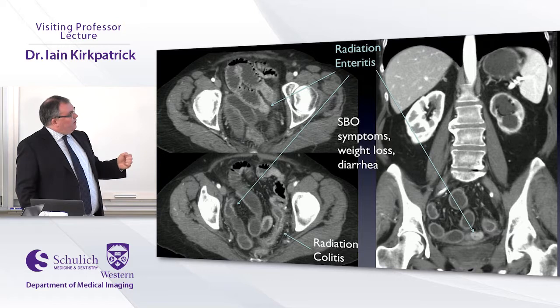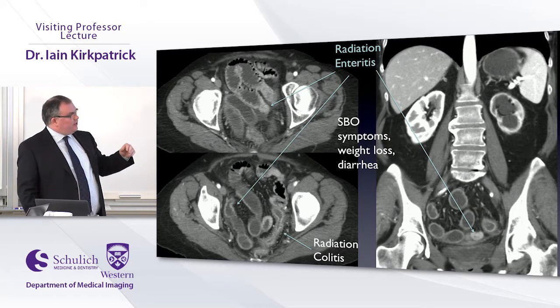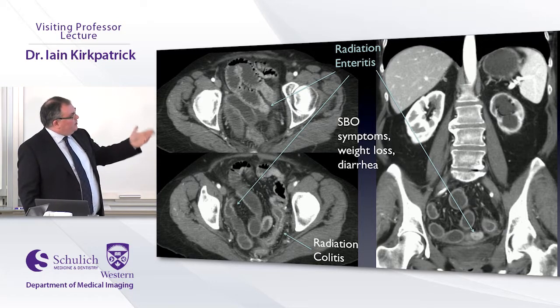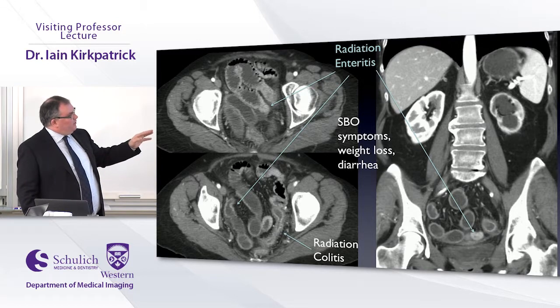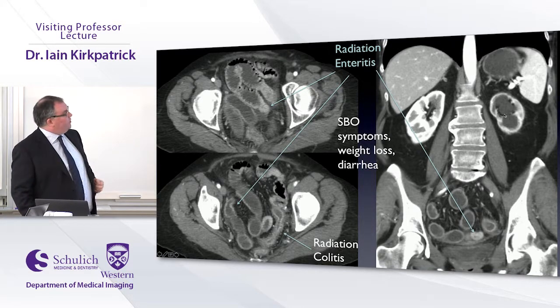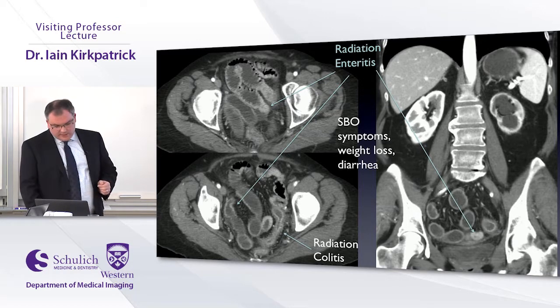Another patient had some malabsorptive type symptoms, diarrhea, and sometimes obstructive-like symptoms. We did a CTE, and they had pretty classic findings for radiation enteritis, which became evident when we did a history and found that they had pelvic radiotherapy. You'll see that they also had previously undiagnosed hydro because of a pelvic ureteric stricture as well. The colon's also involved in that particular case.